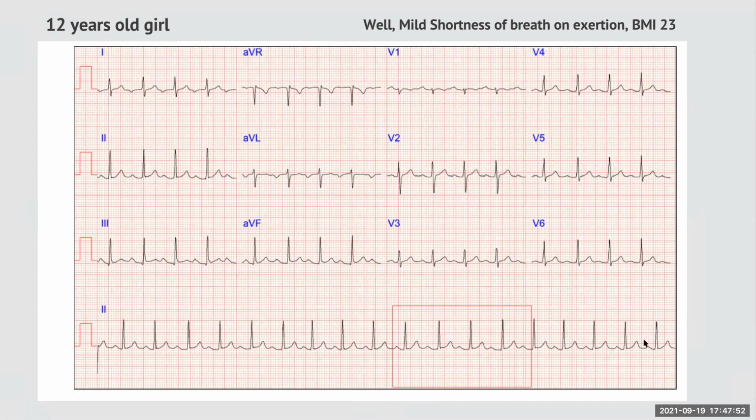Just have a go. Sinus tachycardia. Okay, very good. So one thing we established here: this is sinus, this is tachycardia. Again, don't go for the diagnosis. So tachycardia is fine, absolutely wonderful. Now, if it's a tachycardia, do you think it's a regular tachycardia or an irregular tachycardia?